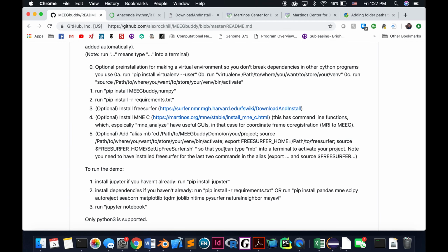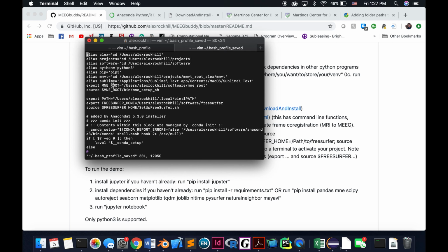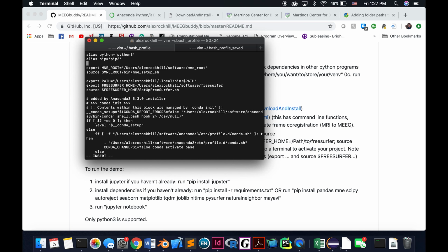So I'm just going to grab those commands off of another file that I had saved. So these commands here are these 5 here. So that might be a little hard to follow, but if you can have all these files, have these commands written in yours, that will make these all run.